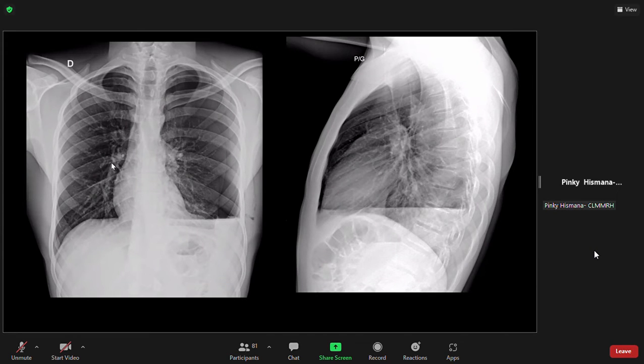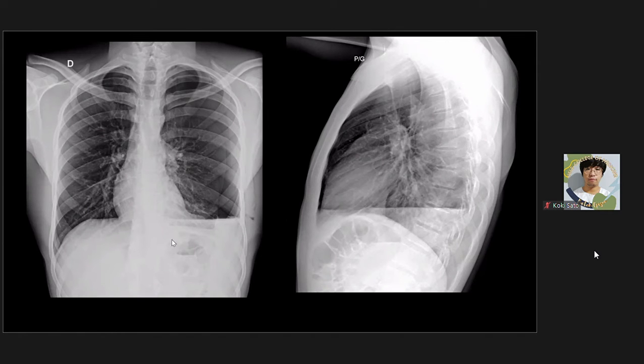Okay, let me help you. The right lung is actually normal. I do understand that it's really quite difficult for you to discern at this moment whether it's normal or not, but you take my word for it. The right side is normal. This hilum, this opacity here is actually normal, and it's because of the vessels, primarily the pulmonary vessels. On the other hand, these branching linear opacities, which you see, are pulmonary vascular markings which are normal. The abnormality here is actually at the left lung.